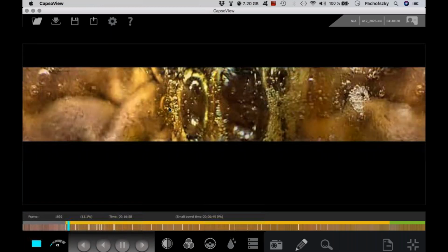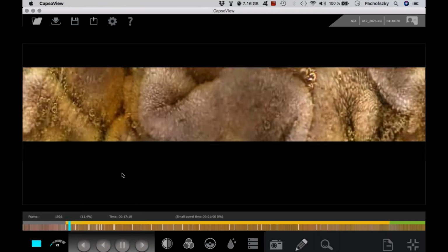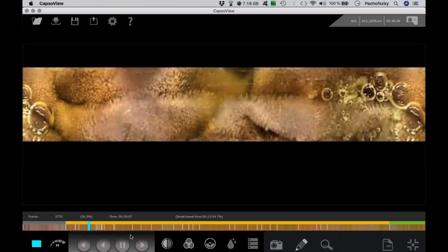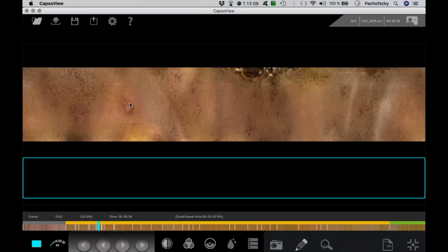This was a young male person with loss of weight and diarrhea, and so you can imagine what we will find. They will going on a little bit because we have also a lot of lesions. You've seen it before. So we have different types of lesions. You can look at this here. It's a small aftoid lesions in this area.